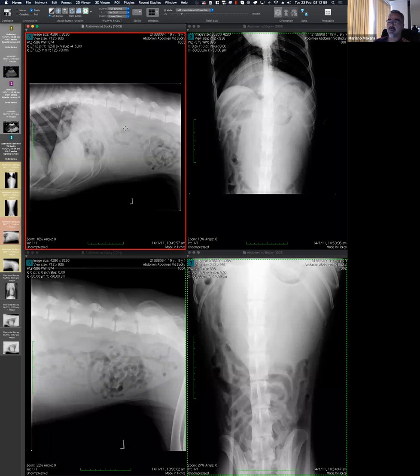So it's not only not coming from the kidney, because we can see the kidney, but it's also not displacing the kidney. It seems that the kidney is not bothered by the mass. Makes sense? It's in the normal place, normal shape, normal contours and opacity. All the features are there.